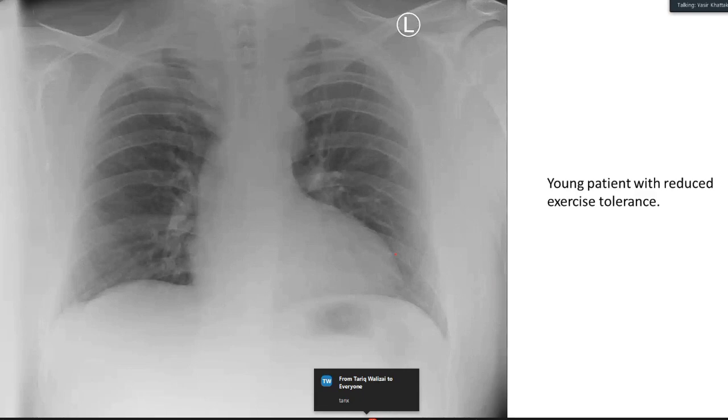Do you know if this is an AP view or a PA view? You never asked. So this seems to be an AP view. So what else? What differential diagnosis comes to your mind? So if there is cardiomegaly, it's your case. I'll wait for you to decide.